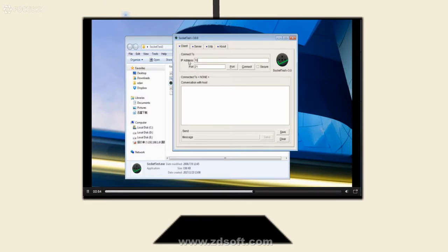I enter the patient monitor ID, I enter the port number, which is 9100, and I connect. If I have configured everything correctly, I will receive a confirmation message of the current patient using HL7 format.